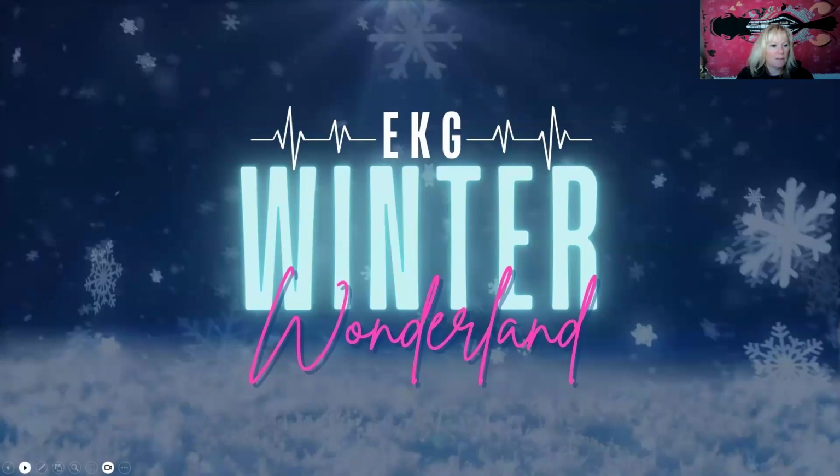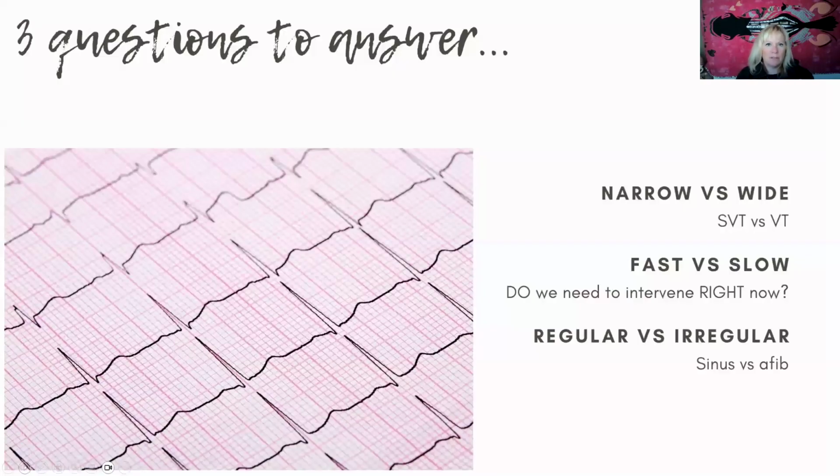So here we go. Three questions that I always ask myself when it's time to interpret a rhythm. This will help you no matter where you are or what you're doing in any walk of life, EMS or otherwise. The first question: is the QRS narrow or wide? If it's narrow, we know it's coming from above the ventricles. If it's wide, it's coming from below. That's the big clue.